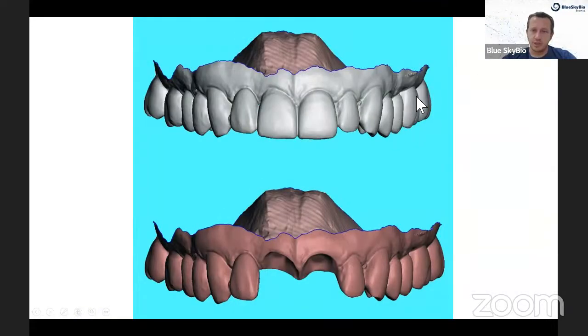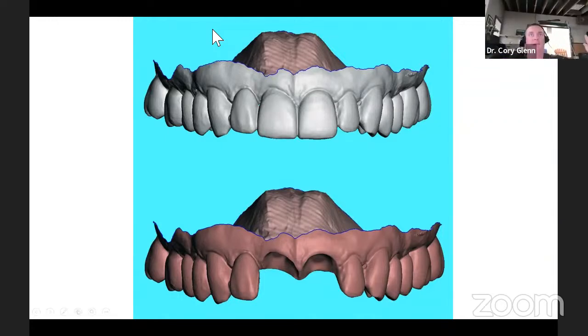The next question is, are you planning the implant following the wax up of the crown, or are you placing the implant first and then adjusting the root position and the bone considerations? So I always do everything based on prosthetic positioning first. Normally that would be doing a wax up or digital mock-up. However, in this case, this guy liked his teeth. He didn't really need to change them. You can see those are decent looking teeth for this dentition. And so I was planning the implant based on the existing crown.